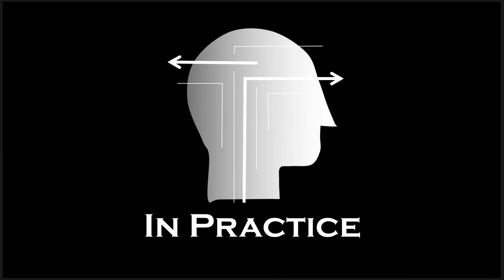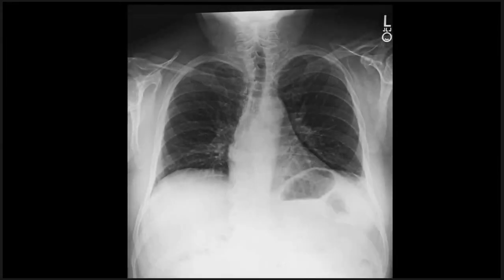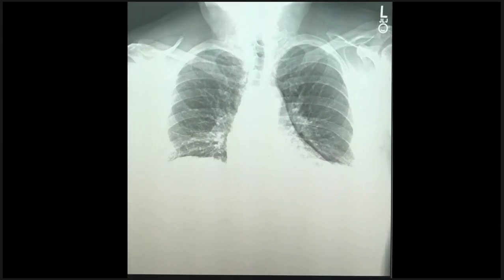Now there's one more case here, something that I want to point out. This one is just a little bit different. So let's pretend that we have a radiograph for a routine situation. Maybe it's a school physical. Here we go, and I'll window this here, just like that. See if you can see sort of a black line right there. Huh, does this kid have pneumomediastinum? That's weird. This kid's got no symptoms.